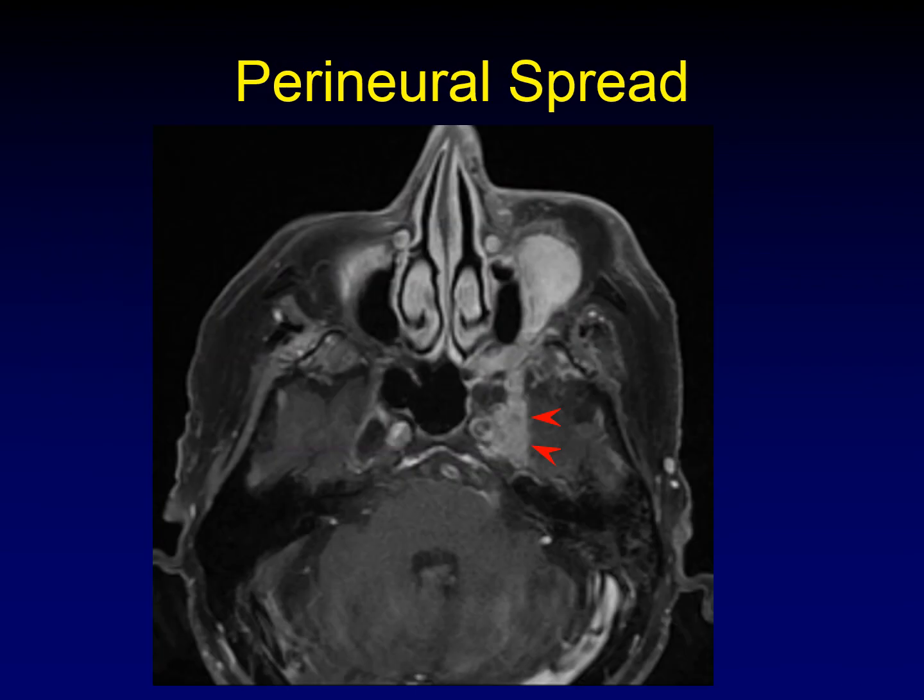Are there some pitfalls that occur just because PET-CT is not the right exam? Yeah, perineural spread is a great example of that. Every once in a while, you'll be able to pick up perineural spread on PET, but it's certainly not reliable for this diagnosis the way that MRI is. And in tumors that are likely to have perineural spread, or patients that have already documented that propensity in their tumor, you really got to be using MRI. Now, you could be really fancy about it and use PET MRI and kill 2 birds with 1 stone, but don't rely on PET alone to find that perineural spread.